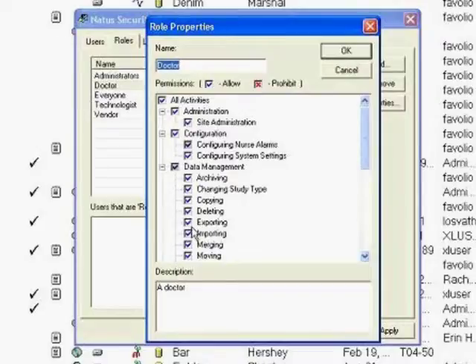All right, so we go into the audit log that keeps a record of user activities. And sometimes what we've seen is that everyone is logging onto the system as administrator. So everyone has full access to the system. That's one scenario. When you have that scenario, you can't identify who the administrator is because everyone's using administrator as the login. So you can't really trace it back to which user actually deleted the study.